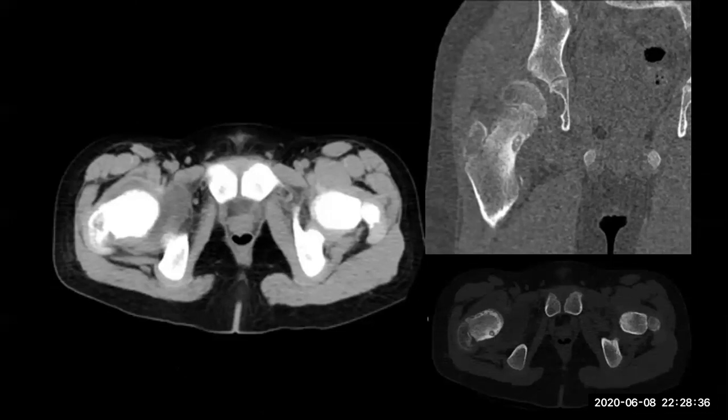Okay. If we do a bone scan, we can see the double density sign. Very good. Another advantage of bone scan, other than the diagnosis, is to see if there is more than one nidus before treatment. We can also use a Geiger probe in the operating room to see if any of the nidus is left.